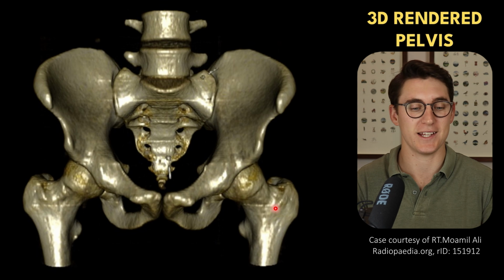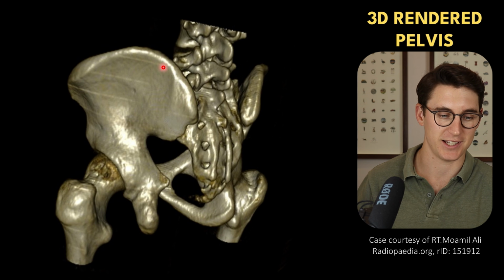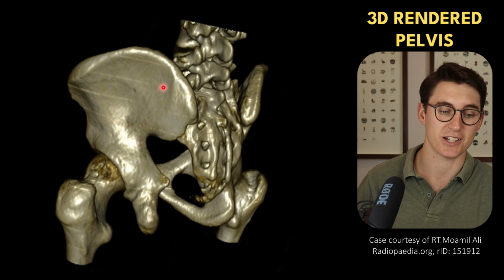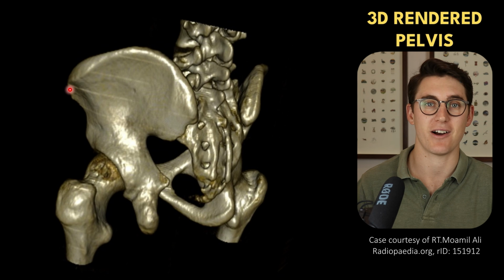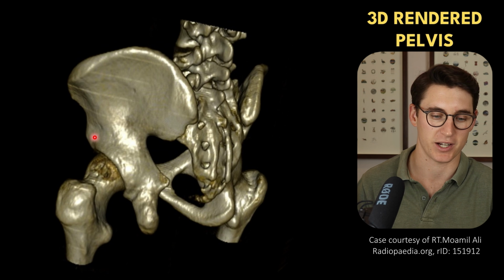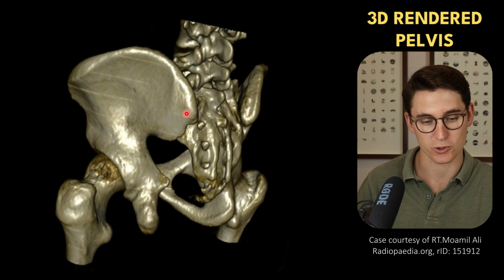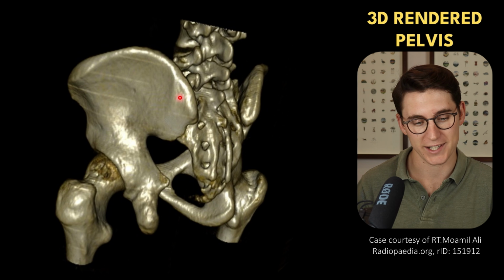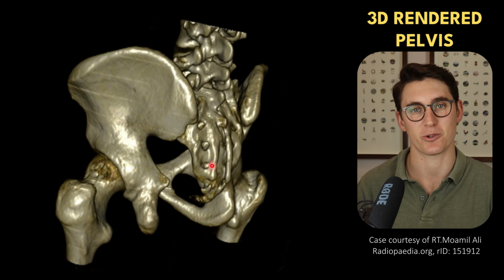If we were to rotate this pelvis round, we can look at an angle posteriorly. We can see the iliac wing here and iliac crest. Here we have the attachment site for our gluteus muscles. And you can see anteriorly we have our anterior superior iliac spine and our anterior inferior iliac spine. Here posteriorly, the often forgotten about posterior superior iliac spine and posterior inferior iliac spine, right at that SI joint as the iliac crest comes towards our sacrum here.